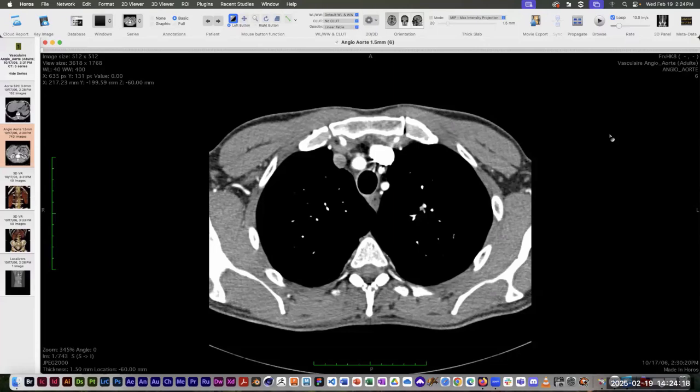I'm going to start with the hard way, and then I'm going to show you an easier way, and then I'm going to show you an even easier way. But it's helpful to know all three of them because sometimes you can use the three of them together in combination to really capture some complex, difficult structures that may be difficult to segment any other way.